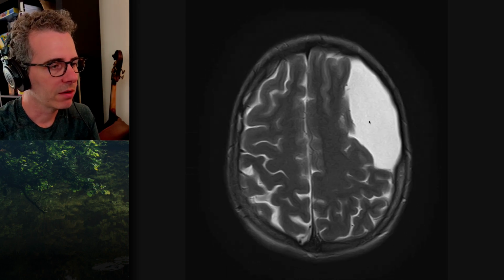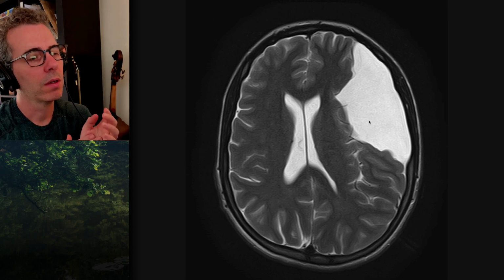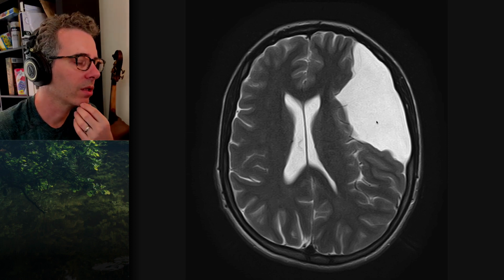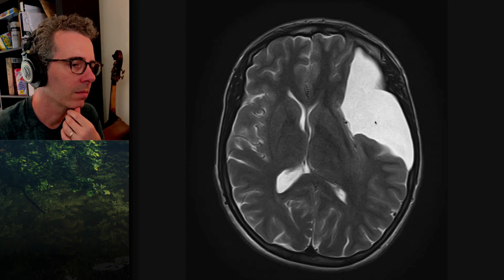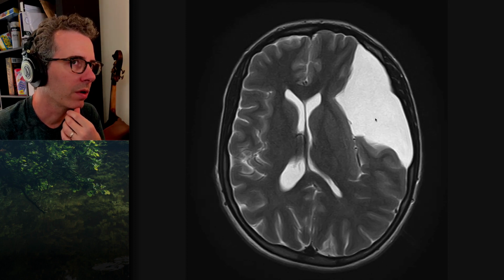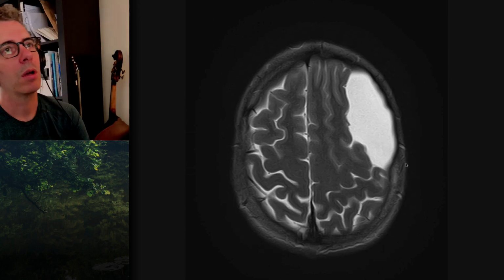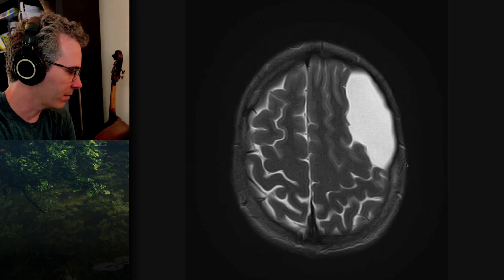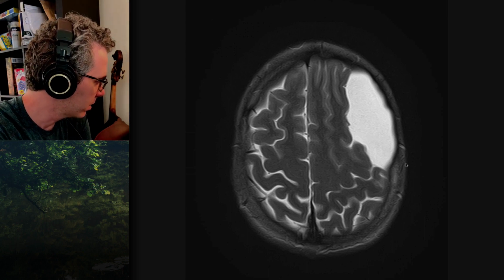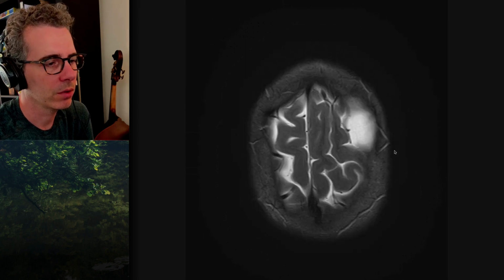And then what's the third differential if you're thinking about porencephalic cyst versus... schizencephaly, open schizencephaly. And so what would you want to see there? So that instead should be lined by grey matter. What sort of grey matter? Heterotopic or abnormal appearing nodular grey matter. Yeah. It's always polymicrogyria. And what else does it have to be if it's called schizencephaly? It has to communicate with the ventricle. Yep. Which this one doesn't.